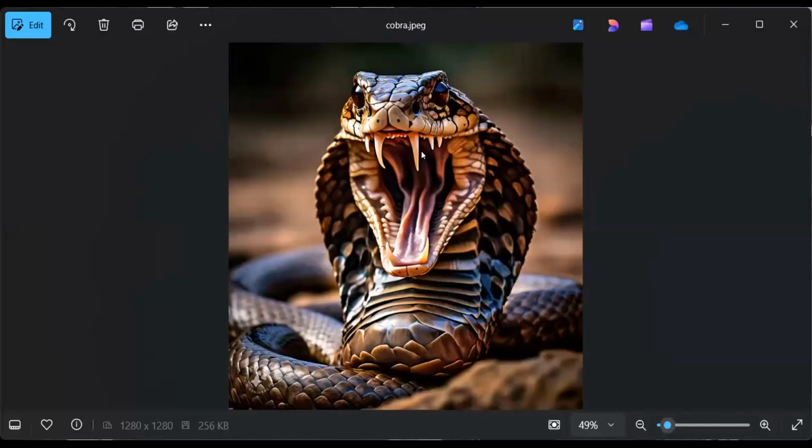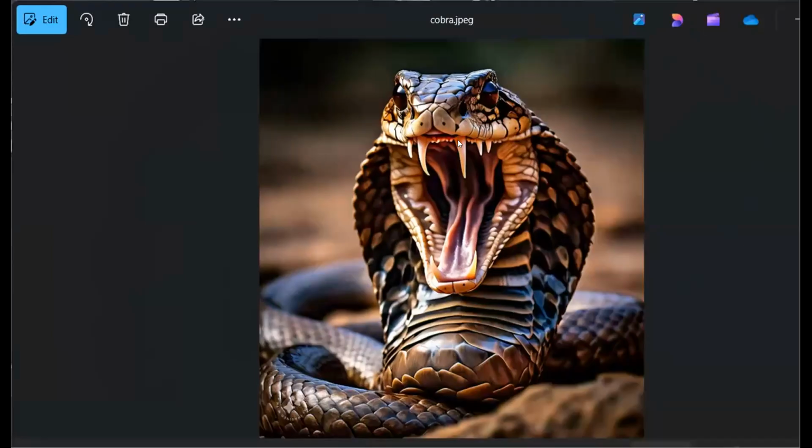Here you go. Right here, you can see the two fangs of a cobra. There's a little bit of space in between, and it should be nice and sharp. So if you're thinking about the epiglottic folds, that should be nice and sharp, particularly at the top portion.